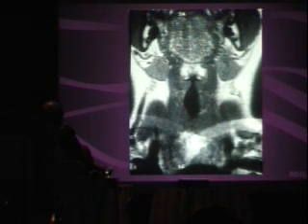The most useful image is usually the coronal image. In the coronal image, the most useful feature is the false vocal cords, the supraglottic cords, above the laryngeal ventricle. This laryngeal ventricle is a little air space. Above that, on pre-contrast T1 coronal, there's a lot of fat. Fat is your friend. Fat is T1 bright. And below that is just muscle.